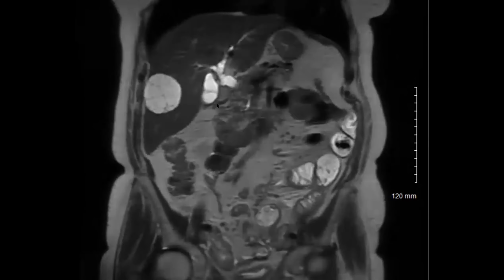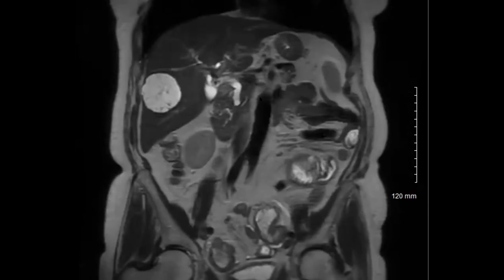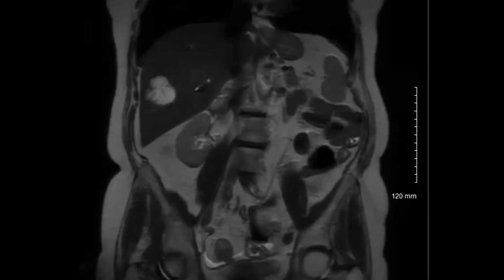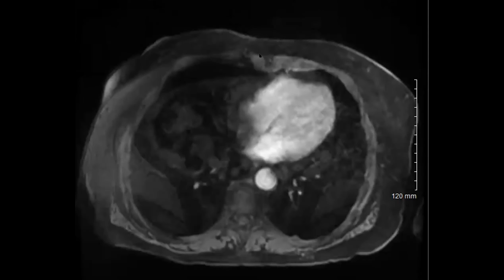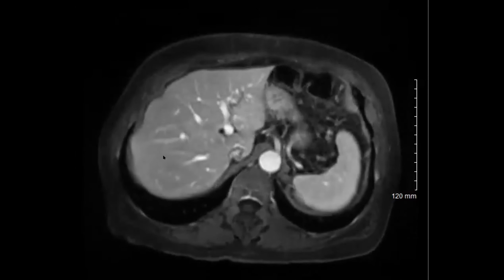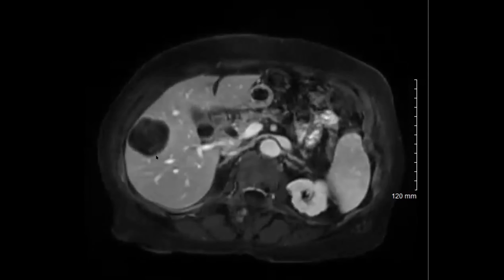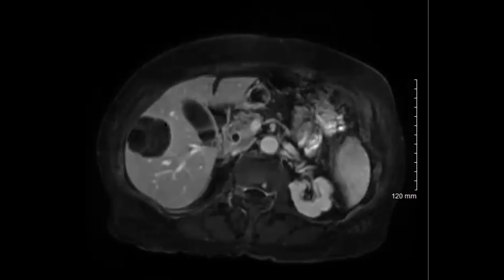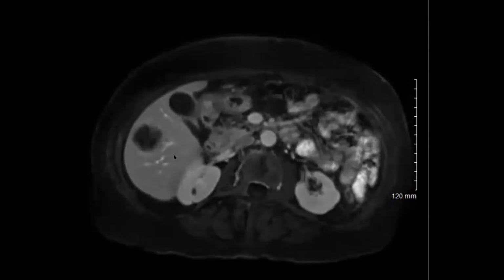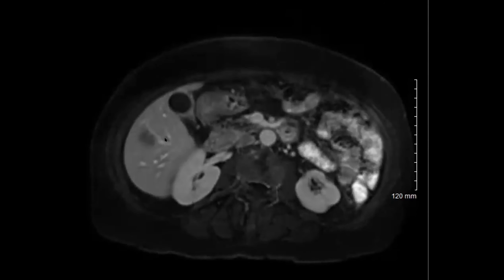Yeah, that was what I was wondering, because usually we say left, like segment 4. Yes. And then also they should have a capsule. So they shouldn't have as much of a lobulated edge because they'll have the ovarian stroma capsule. Yes. But I do agree with Nelly that the rounded shape, the septa and the lack of affiliation with a major bile duct do look more like an MCN. I'm going to share Cookie's and Sudarka's paper when you finish, so we can review the cartoon because I think that's really helpful.